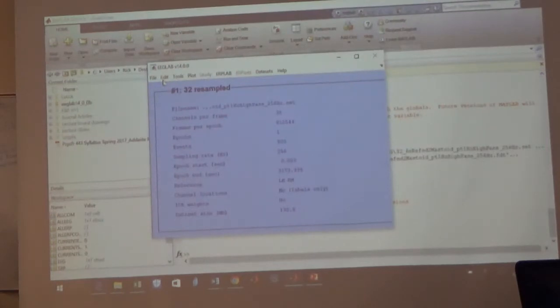You know what we'll do first? Let's imagine, what if our next step crashes everything that we just did? What if MATLAB craps out on you and it says error, and we've got to close MATLAB down again, and then do something else, and you've got to load it all up again. Do you want to have to load the channel locations again?